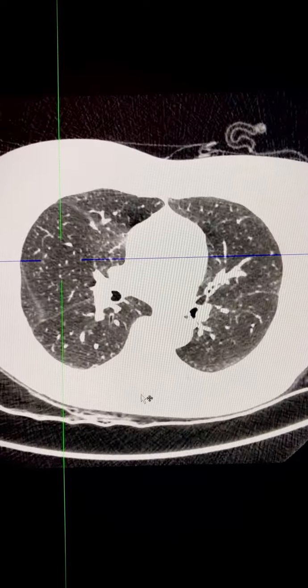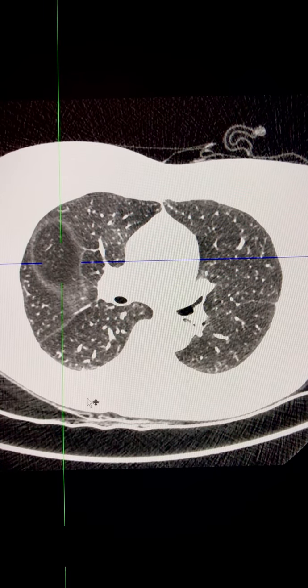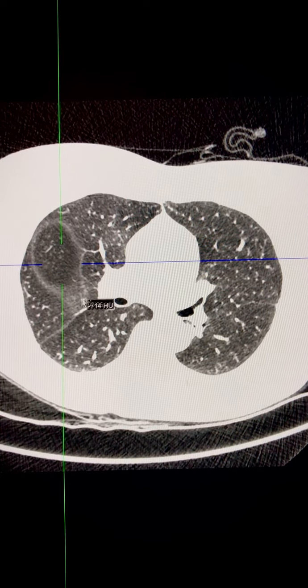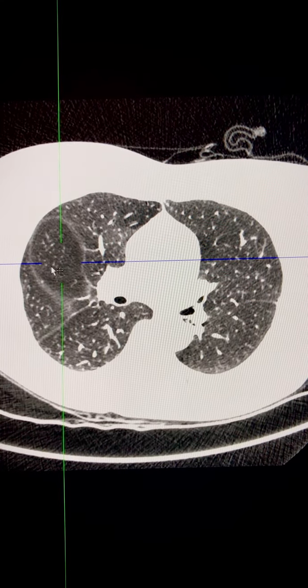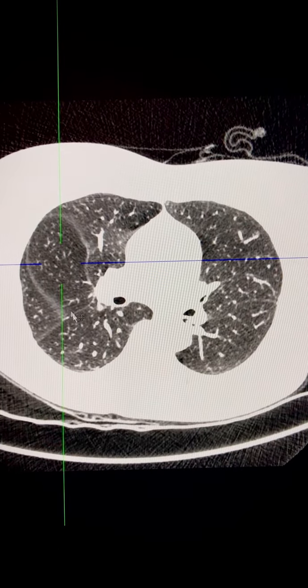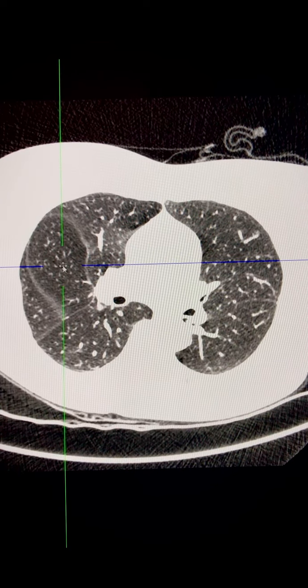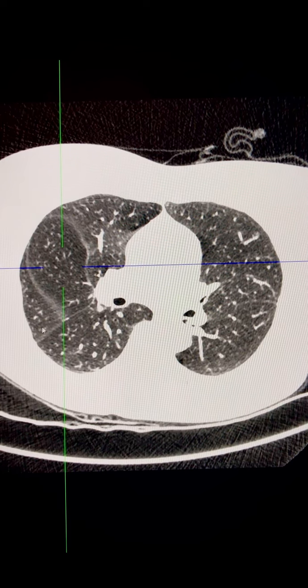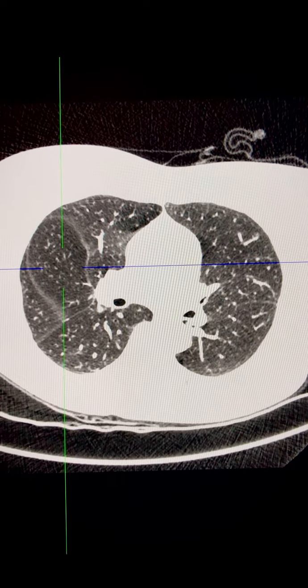In the right lung, there's an additional fissure called the horizontal fissure, which normally extends in the anterior-posterior direction. Despite being horizontal, the fissure is not entirely a straight line, and when viewed on an axial image, you can often have the confusion of having multiple bands like this. To appreciate this, it's best to look at the sagittal and appreciate that the contour of this is rather like a dome. So we're going to change this to a sagittal view, and here we are.